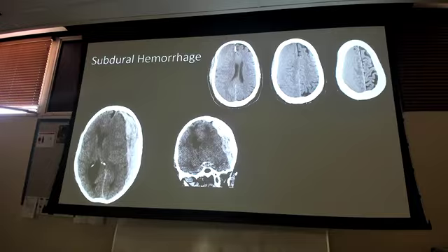So it's that crescent shape, subdural hemorrhage, right in there. Now when you get into your isodense phase, this one is kind of right here. This is my chronic older bleed. It starts up in this area, follows it, but I'm starting to get that mass effect. It's right in here, and starting to shift over.